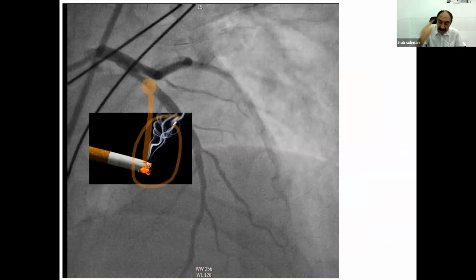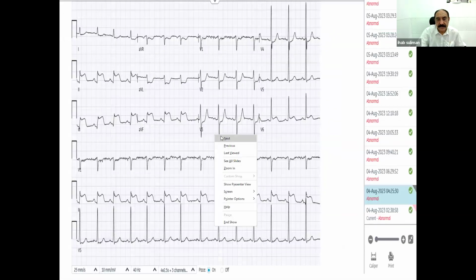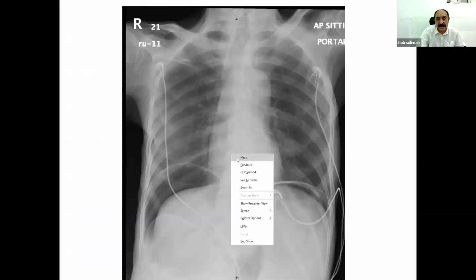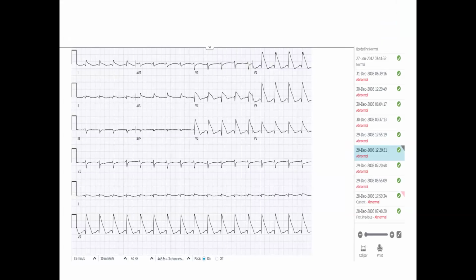We hope, let us take another example of another very, very interesting ECG. If you allow me, I will go fast to the last example. Okay, so what do you call the ST elevation here for this patient who came in cardiogenic shock? So what do you call the shape of the ST?